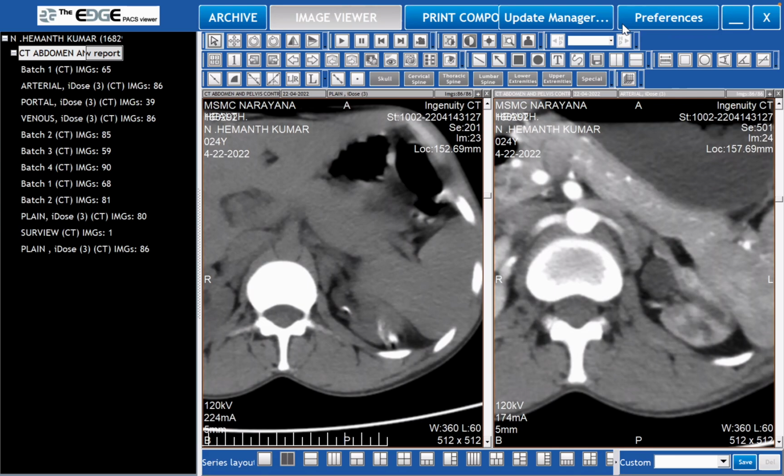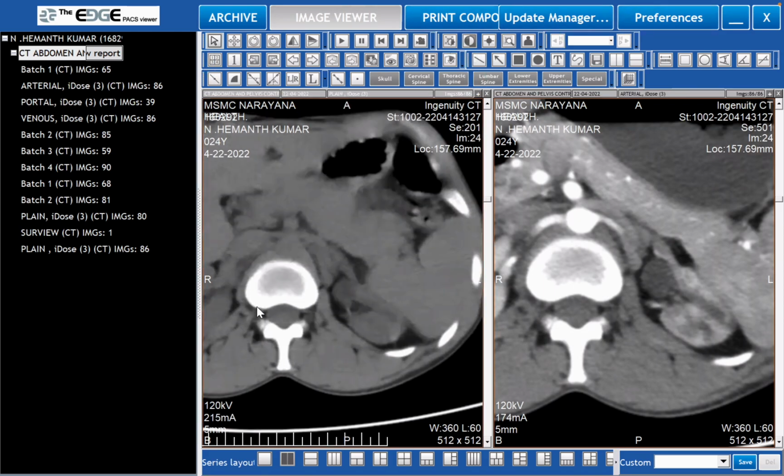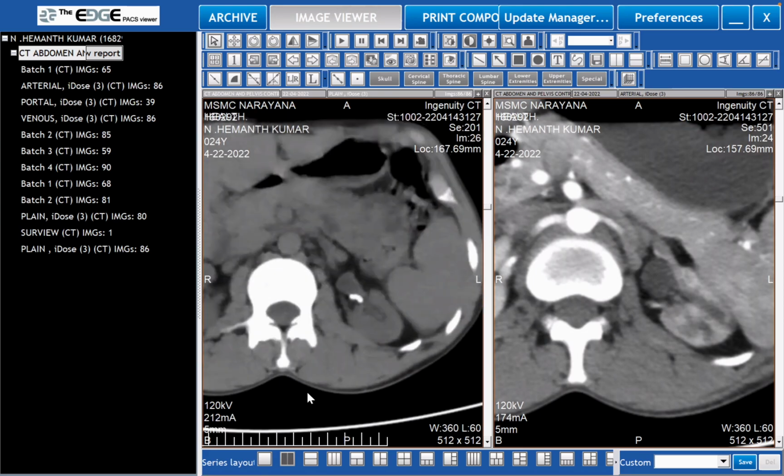That gives you an indication as to the state of function of the kidney. We don't look at all these parameters, but a good kidney will have a good renal artery. A poorly functioning kidney will have a very poor quality renal artery. Your nephrectomies for small kidneys, those arteries are so tiny, nothing at all. So look at it, compare it. So the caliber of the left renal artery is less as compared to the right side. You have to comment on many factors. All these parameters will give you ideas as to what is the state of function of this kidney, what is happening here.